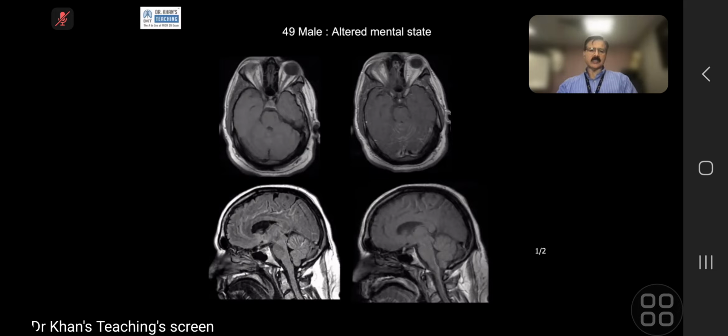This is your first answer. I will give contrast. If there is any enhancement, you have got the differential diagnosis of leptomeningeal processes. If there is no enhancement, subarachnoid hemorrhage will be one of the differentials. You can take the help of, let's say, SWI sequence, like our case. In this particular one, there was high signal on the FLAIR sequence.